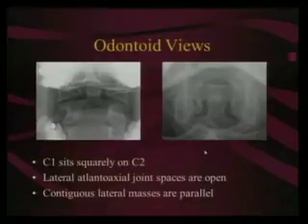Several areas you want to look for. You want to look at the lateral masses, the base of the dens, and the dens tip. Here's a good picture of a dens here. See it? Nice. Type 1 dens fractures are at the top. Those are avulsion fractures of an alar ligament, apical ligament actually, from the tip. Those are stable injuries. Those are fairly easy to diagnose, especially on your CT reconstructions.